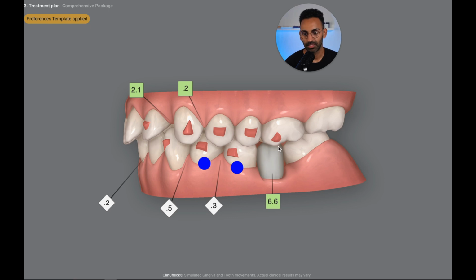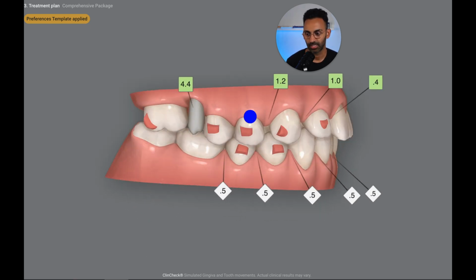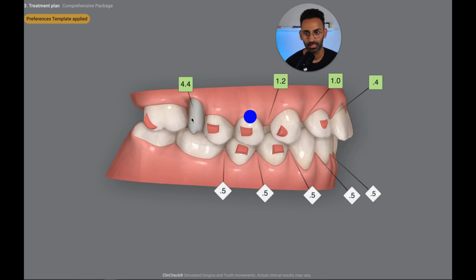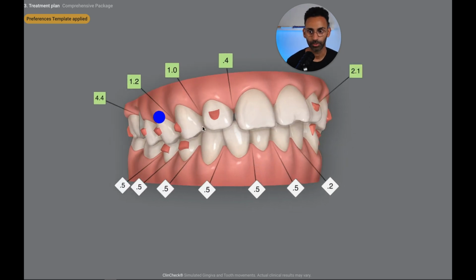So you've got these pontics here, and aesthetically, sure, it's great because it looks like there's a tooth there. But personally, I like to have no pontics when there are spaces, because I would much rather have the trays hugging these teeth. Because if this pontic is gone, you're going to get more plastic wrapped around this molar on the distal or on the mesial, and more plastic wrapped around the distal of this premolar. And so that way you actually have more control over the tooth.